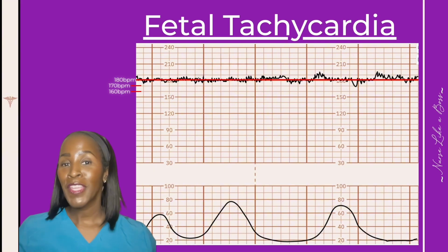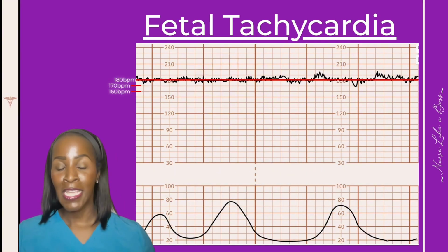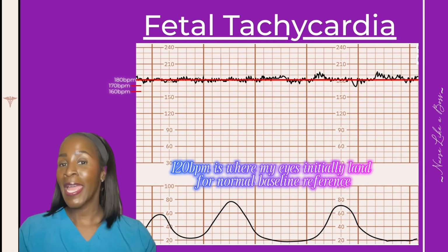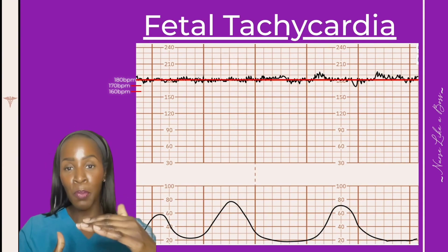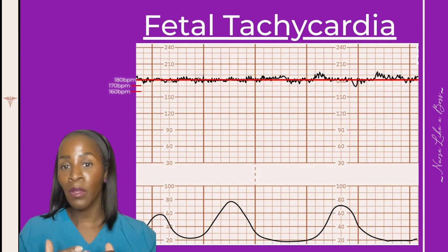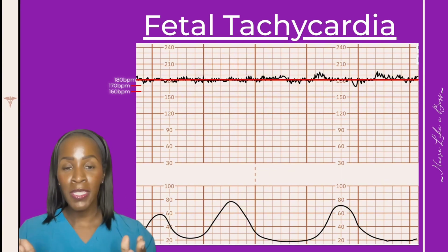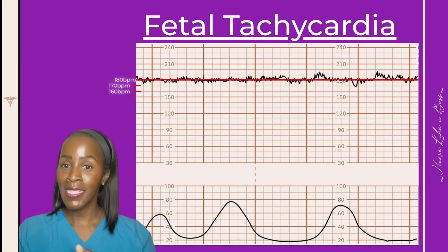As a reminder, fetal tachycardia is a fetal heart rate greater than 160. So automatically when I approach this tracing, I go right to the 120. I see what I like. I love me a good 120, and I see my fetal heart rate is nowhere near there. So then I go up and I see the next bold line is identified as 150. And then I count up from there, 160, 170 line, and now we are landing at 180, which of course, as we said, anything greater than 160 is tachycardia, and that is the case here.